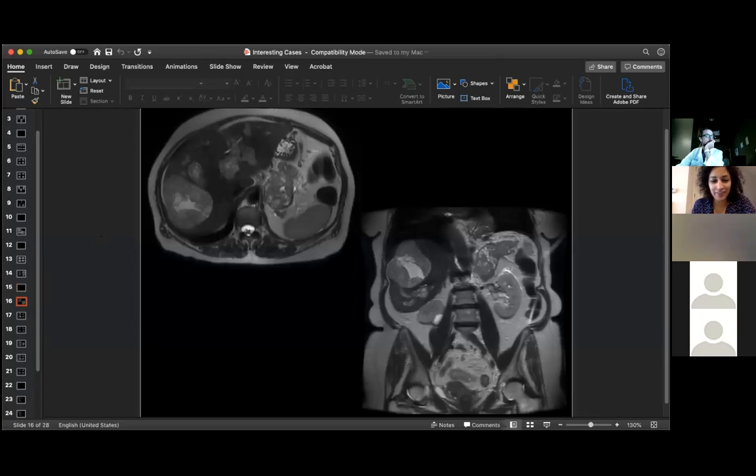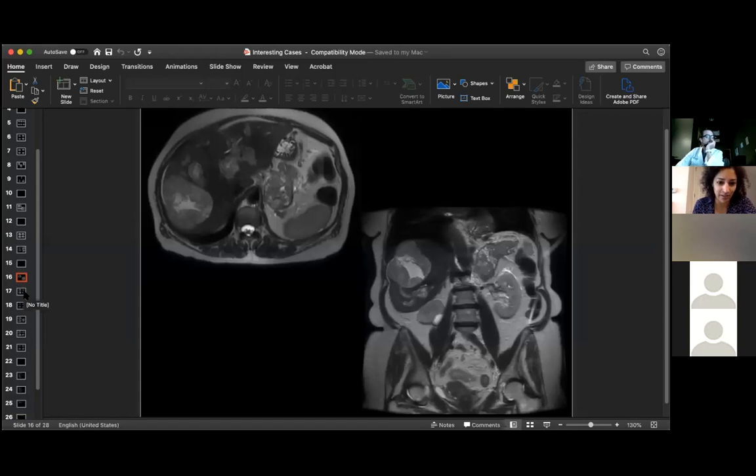Any guesses out there? I'm seeing some evil gray in the liver. It seems to be going along the portal vein. This seems separate from the biliary tree. So I'm thinking maybe like a portal vein leiomyosarcoma with intrahepatic Mets. Okay. Anything else on these T2 images that's abnormal?